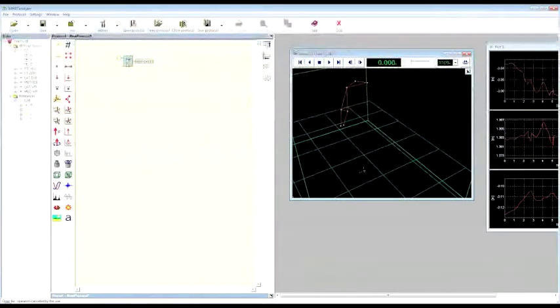Okay, so if you move the mouse close to the block, to the operator, you can also visualize the meaning of the operator. So, for example, in this case, we have temporal mean of an object track. Okay, if you select the operator and if you select the right menu you can get from the mouse, you can choose between copy or remove the operator. So now I'm going to remove.